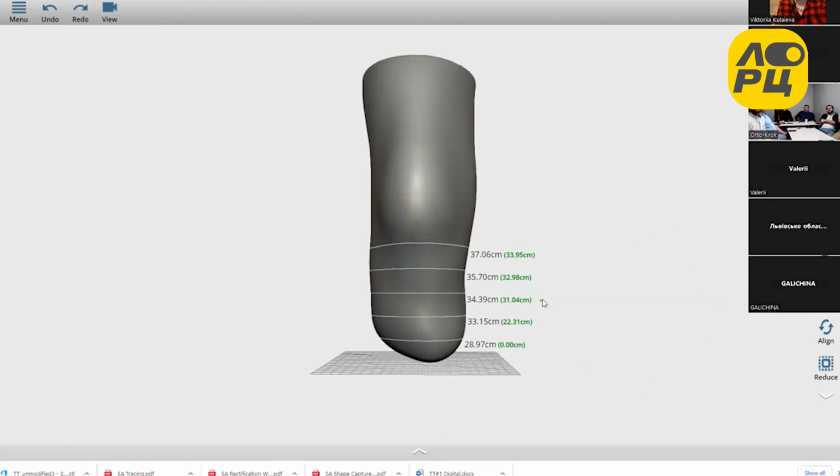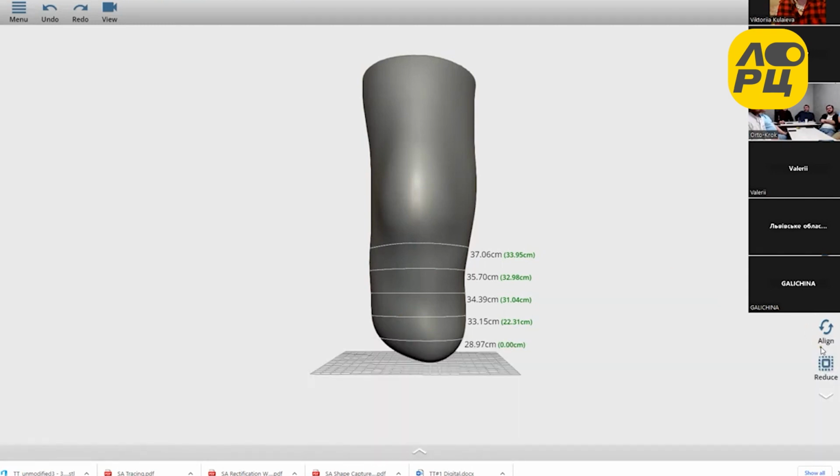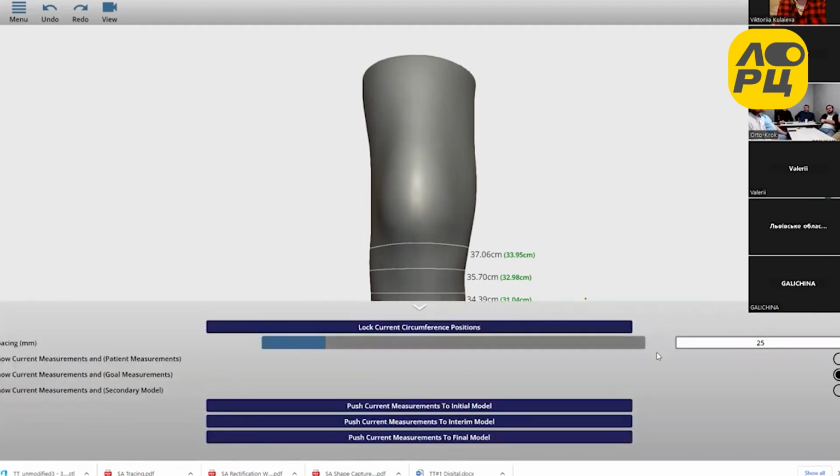I'm just trying to show you what those measurements denote. Okay, so if you click on circumference, do you see that? It will tell you what these two measurements are. When you click circumference, you see on the screen the explanation of these first two measurements.